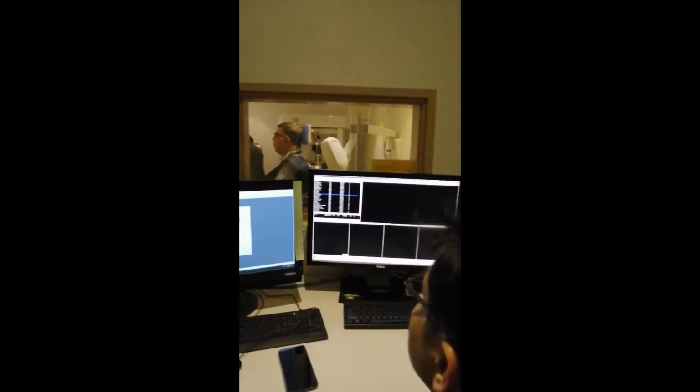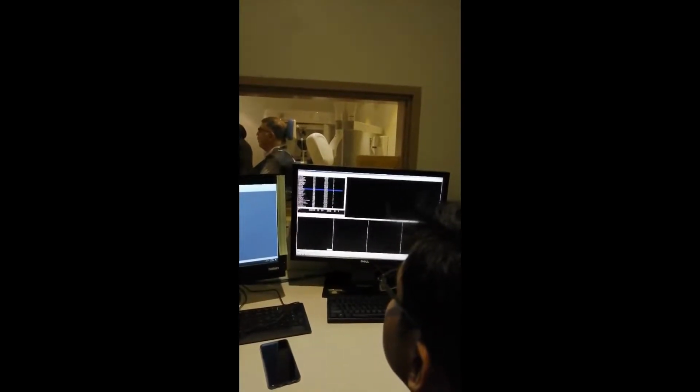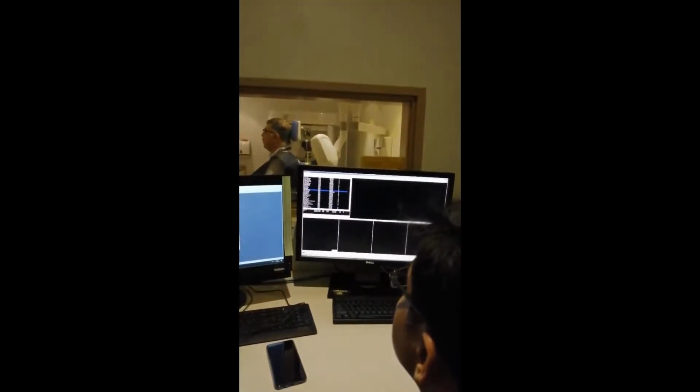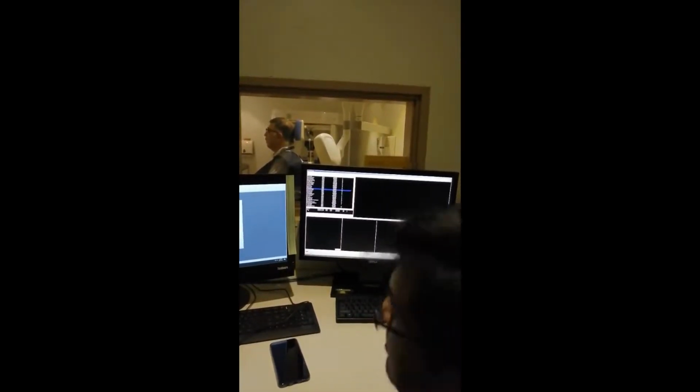So this is the patient list. There are so many images taken in this CBCT machine, so we just randomly choose one. When I click on this, it shows the registration number, patient ID, date of birth and gender. When I click on anyone, it comes as raw CT or CT. So you should click on the CT. Raw CT means it is before reconstruction, right? Yes, raw CT is before reconstruction.